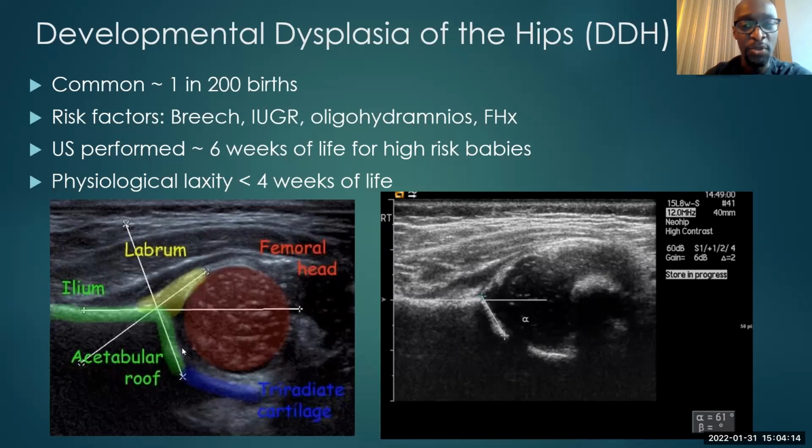This is the acetabular roof, and we would like that to be nice and deep, because you want the femoral head to sit well seated within a deep acetabulum. So this is a color coded diagram here, and then this is a real life clinical image.